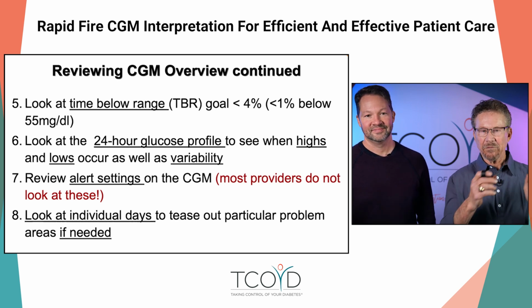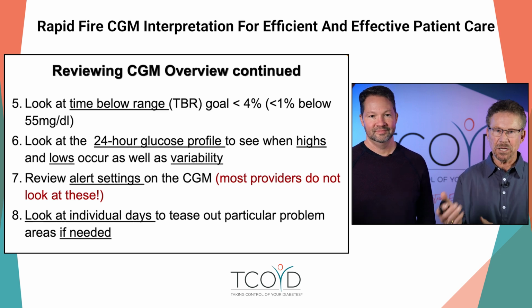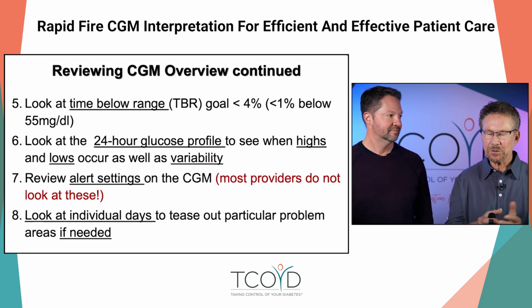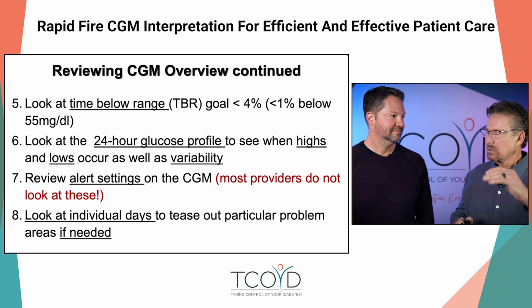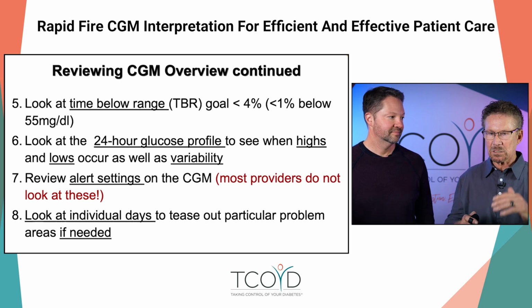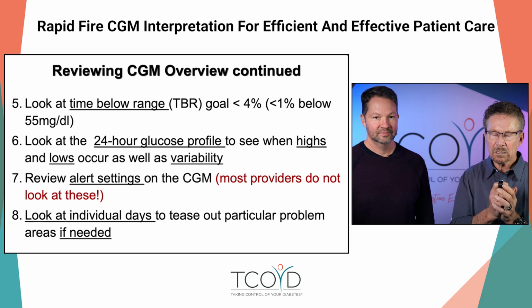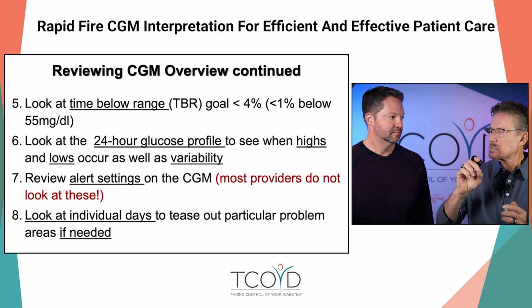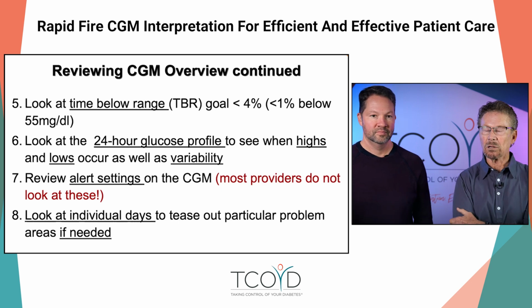And then they have individual days. Now, if you have a patient that's doing well, you don't have to do this. You're done. And you can talk about their favorite Peloton instructor, if someone's doing well. But sometimes it really is instructive to look at individual days to see trends. And sometimes if you have time, I know time is tight these days, you might pick a day and say, what sort of happened this day? And you walk through it, and you can learn a lot by doing that.